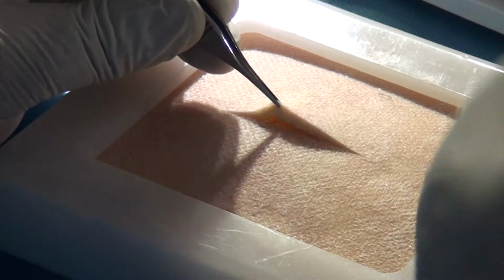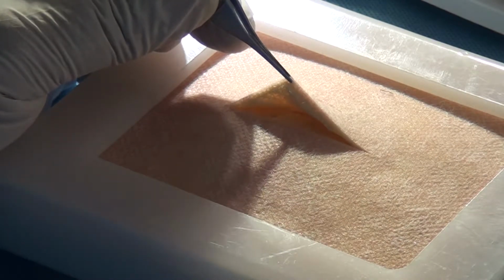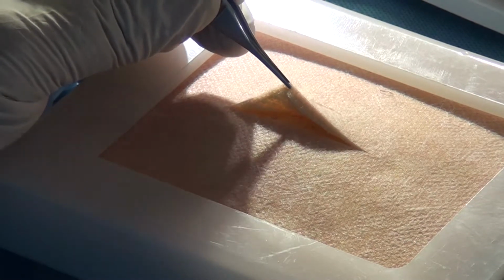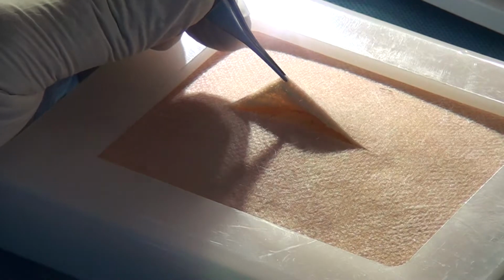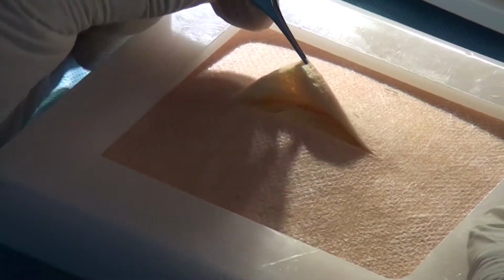Please focus, concentrate here. They observed the holding of skin with the tooth forceps and plain forceps, and they found that the amount of force you have to apply to hold the skin with the plain forceps is bad enough to produce skin necrosis. So it can be more traumatic than what you see. The tooth forceps is less traumatic. So don't think tooth forceps is traumatic all the time. It's about where you use what. Clear? Yes.